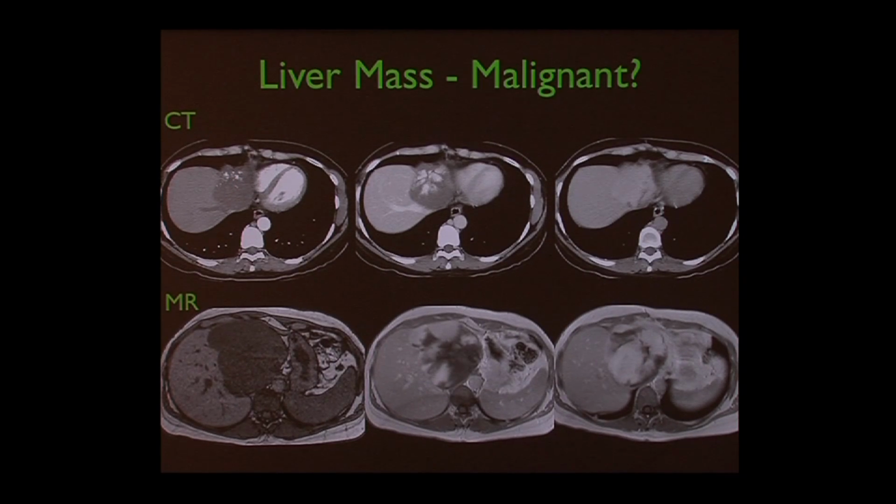Maybe 10 seconds, 30 seconds later, we scan again. And now you can see the aorta is not as dense. The contrast is washing out. Now the veins are beginning, this is the portal vein in the liver. Those are beginning to enhance, and we have more enhancement of the tumor. And then we scan about 5 minutes out, and the mass has completely enhanced.